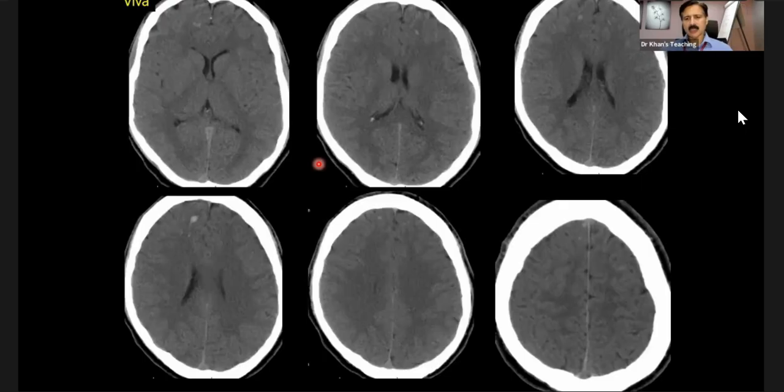Having said that, only 50% of diffuse axonal injuries will have hemorrhage. And if they have small petechial hemorrhage, you will pick them up on a CT scan. Otherwise, you will not pick them up. Whenever there is a discrepancy between the CT scan findings and clinical findings, for example, if a patient has a low Glasgow Coma Scale and the CT is good, the neurosurgeons will just label it diffuse axonal injury, because pathologically speaking, this is what has happened, but radiologically speaking, it cannot be picked up.